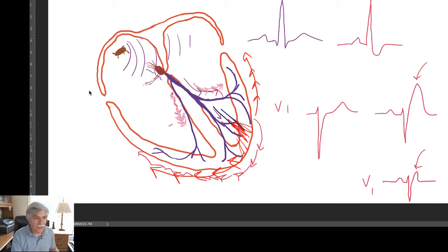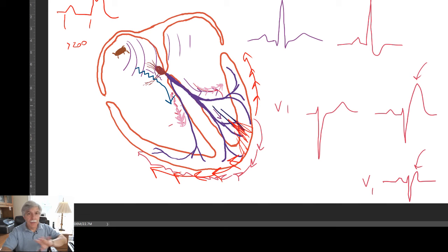what if the fact that you have a long PR interval and then you've got this bundle branch block pattern, so the PR interval is more than 200 milliseconds. How do you know that the delay in that PR interval isn't just coming from AV nodal delay? How do you know that you don't just have delay up here in the AV node before it gets to just a plain old bifascicular block where the third hemifascicle is still healthy? So if you have a healthy posterior hemifascicle, then the ventricle gets the signal on time and everything is fine. You don't have to worry that this person has really severe trifascicular conduction system disease.